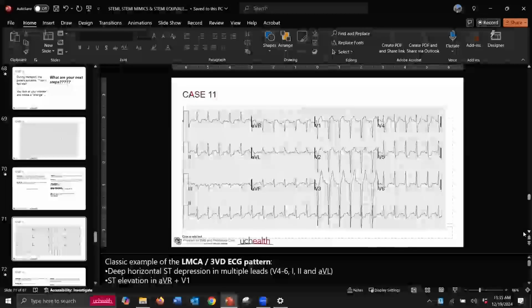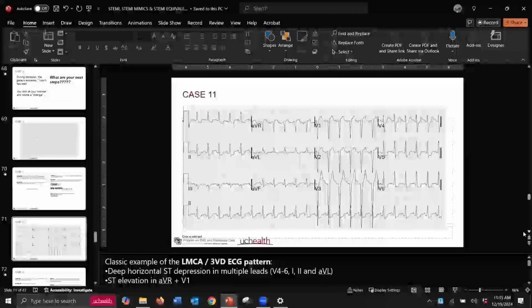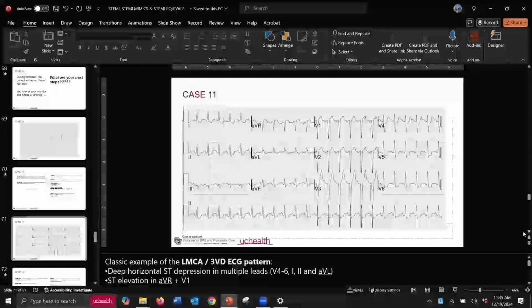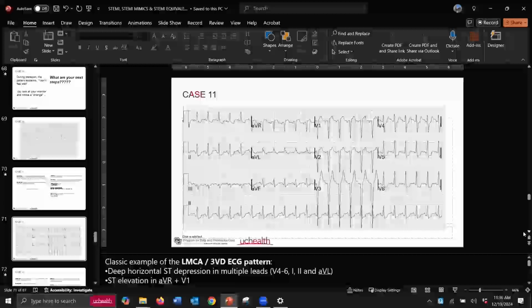So you do the thing. What do you see here? A-tach. I'm going to call it sinus tach. Fair enough. I can see a P wave before every QRS in lead 1, no doubt about it. V1, V2, aVL if you look hard, lead 3. It's sinus tach, no doubt about it.